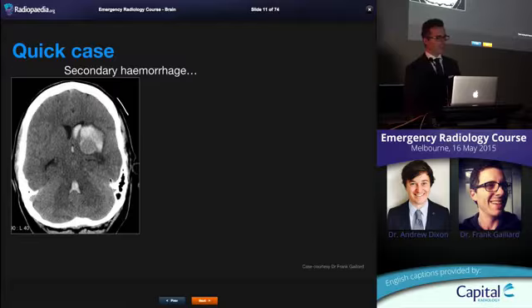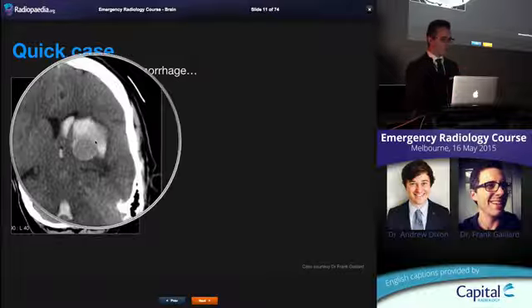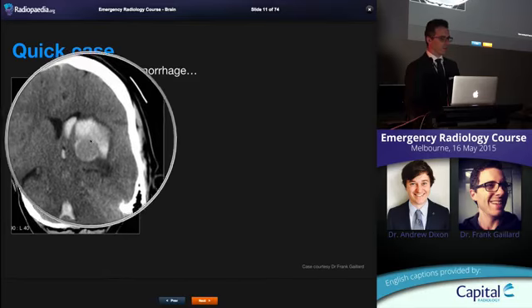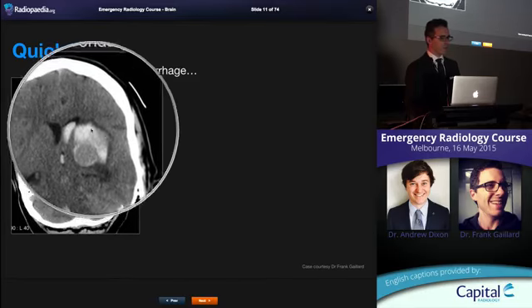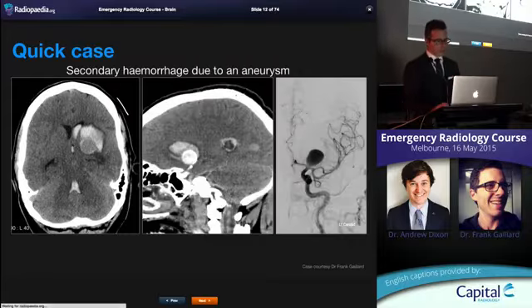And one of the tricks is to look for an area of blood that is not as dense as the rest. As blood extravasates, it begins to clot. As it clots, it retracts and expels serum, which is absorbed by the brain and taken away. And so you're left with a hyperdense blood clot. Where you have non-clotted blood, wherever it is, whether it's still contained within a lesion or has just bled, it will be lower attenuation. And so here we can see this very well circumscribed, rounded structure within a clot. That is not what a normal hemorrhage looks like. You can get hyperacute hemorrhages that appear swirling because the blood hasn't clotted yet, but this very rounded appearance should make you think that there's a rounded lump underneath it.